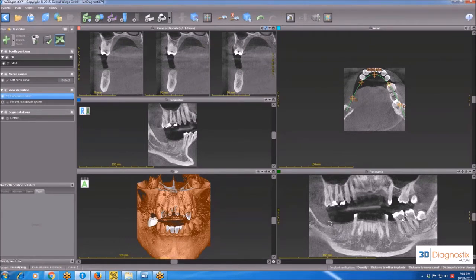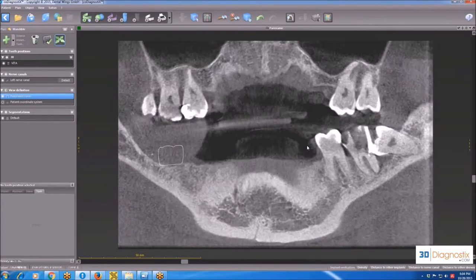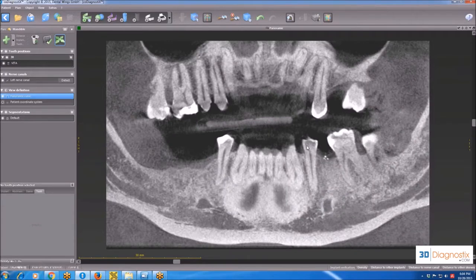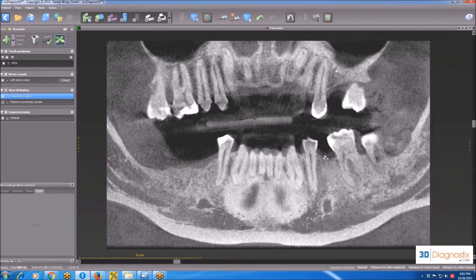As you can see, the panoramic view doesn't really look like the normal view we are used to, but that's because the panoramic view we are looking at right now contains different slices. If I want to superimpose all the panoramic slices to give me the normal look that we are used to, I am going to click on that flower-like icon on the top right window corner.